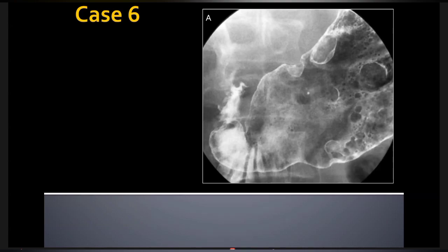Yeah, why do you say that? Tell me, why are they polyps? You're right, they are polyps. But I want you to understand why they're polyps and not ulcers, yeah? Because if you look at this one, as you very correctly pointed out right at the beginning, this is indenting the contour of the lesser curvature of the stomach in the gastric body, isn't it? Do you agree? Yes.